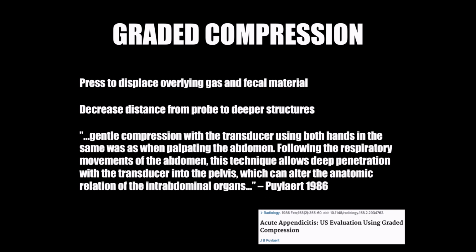Another key when performing bowel ultrasound is the use of graded compression. The use of graded compression provides 2 primary goals. The first is to displace overlying gas and fecal material. The second is to decrease the distance from your probe to the deeper structures, and by doing that you get increased resolution.